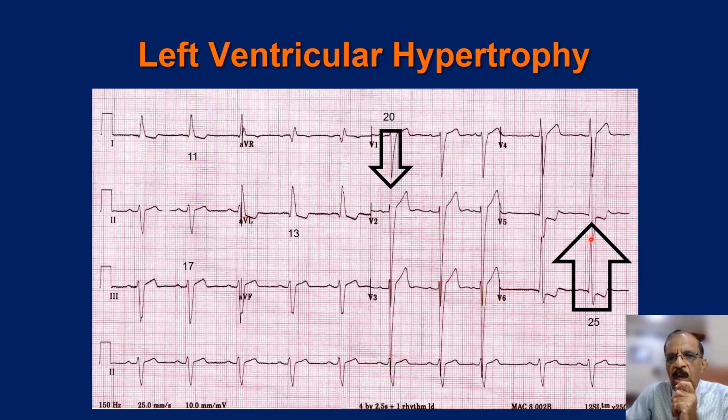Whenever you measure the height, you have to subtract the S wave. For example, when I have to measure this one, I will have to subtract this one. So you take the total algebraic sum of the R wave. We notice the S wave in V1, V2, or the R wave in V5, V6, we take the taller ones and we sum them up. So that is the criteria.